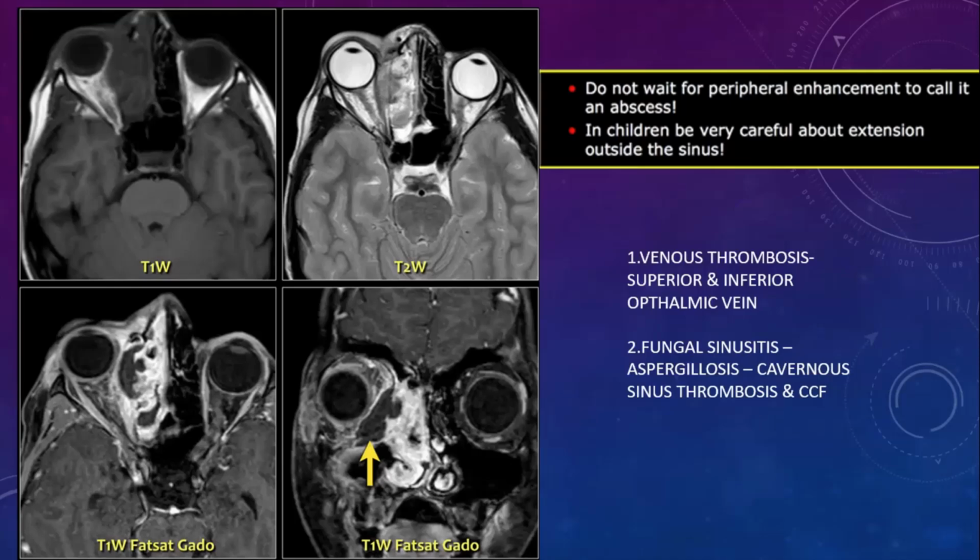This is a similar case with MRI, T1 and T2 sequences, where you can see that the right ethmoid sinusitis is noted, but you can see that the bone content is not clearly seen here. So to look into the osteology or bone-related issues, CT is definitely the first and best modality of choice. But to see the soft tissue structures and where all it is invading, MRI will throw better light.